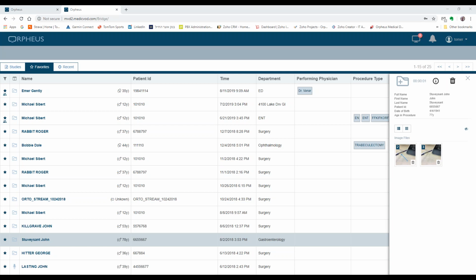So the purpose of today is to walk you through the Orpheus Web application, knowing that we had a lot of interest from clinicians in recording video. The main driver was, hey, I recorded the video, I may need to use it now for my teaching purposes or research purposes. How can I access that? And of course, we want to provide them that access because it's more convenient and more secure, more auditable than just sticking a USB thumb drive into the Olympus video processor.